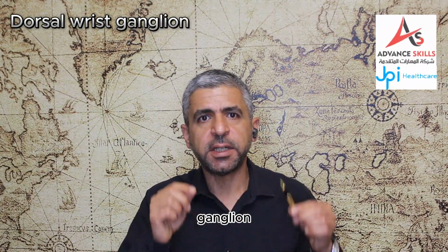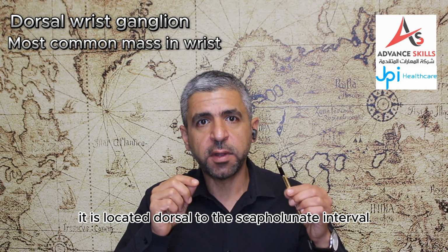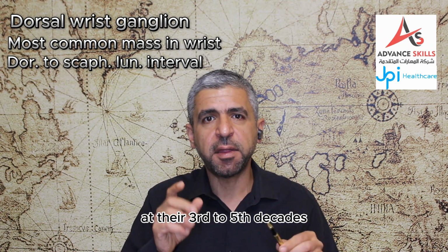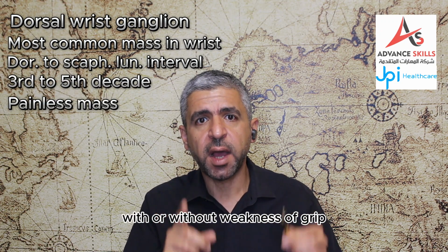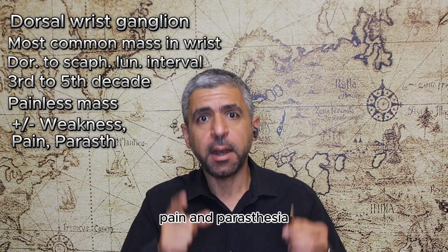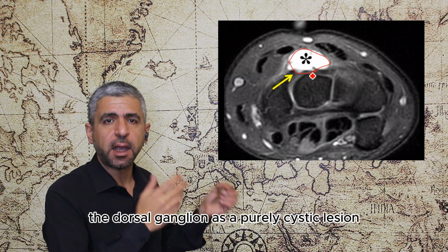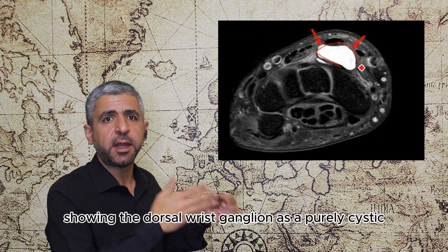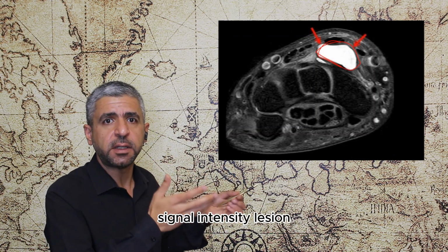Dorsal wrist ganglion is the most common soft tissue mass in the wrist. It is located dorsal to the scapholunate interval and usually seen in patients in their 3rd to 5th decades. It presents as a painless mass with or without weakness of grip, pain, and paresthesia. Like in this example, we can clearly see the dorsal ganglion as a purely cystic lesion. Another example here showing the dorsal wrist ganglion as a purely cystic signal intensity lesion.